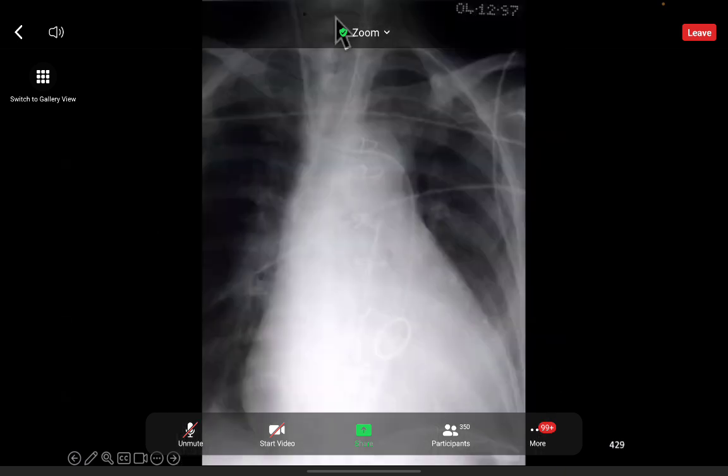Where is that catheter? There are two catheters and they're both heading off down the left-hand side. Yeah, it's a left-sided SVC. It goes adjacent to the aorta, behind the left atrial appendage, behind the left atrium, and then into the coronary sinus, and then into the right atrium.